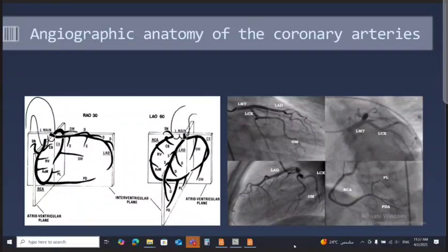Not because of the subtraction, because in the CT you have more details and you can see the artery even without subtraction of the ventricular cavity or the septum or whatever. But the limitation is in the spatial resolution and not in the subtraction. CT is high in contrast but low in spatial resolution. The reverse is angio: high in spatial resolution, low contrast, I think.